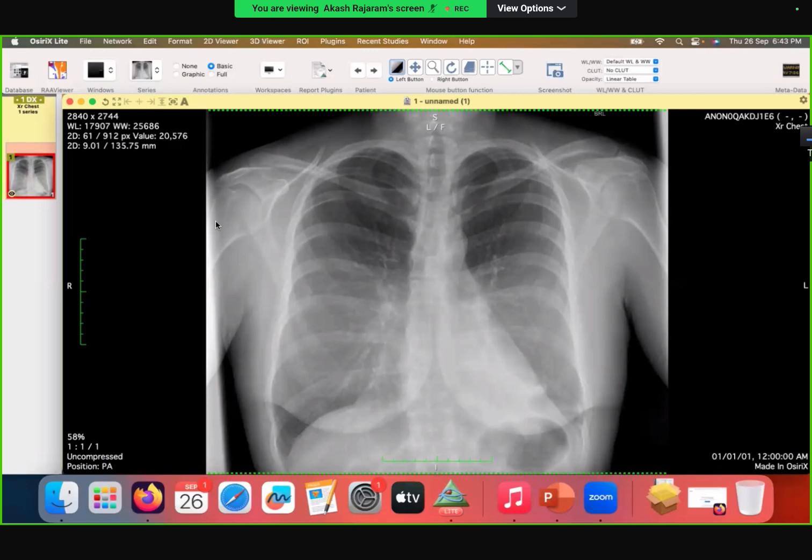So, what is your diagnosis again? Is it pectus excavatum? Yes. Okay, the patient has some acute pleuritic type of chest pain.